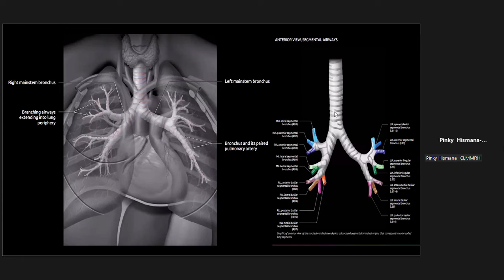structure when we talk about airways. So our trachea actually has two portions. One would be your cervical and your thoracic. So sa x-ray nga chest x-ray, most often what you see actually is your thoracic part of the trachea.